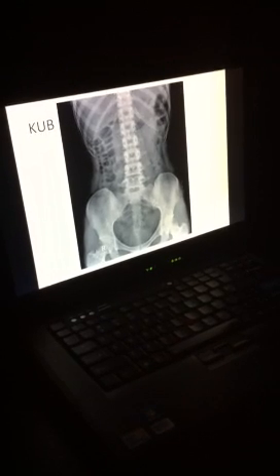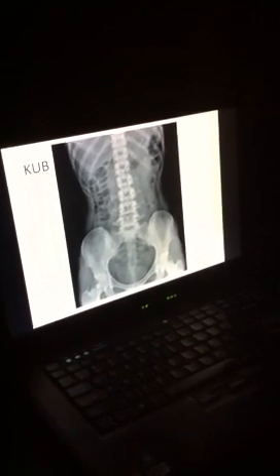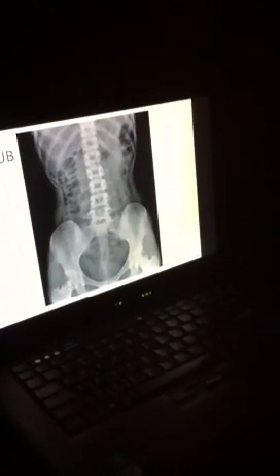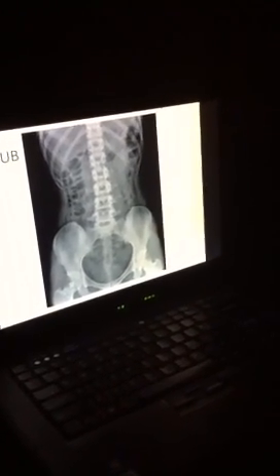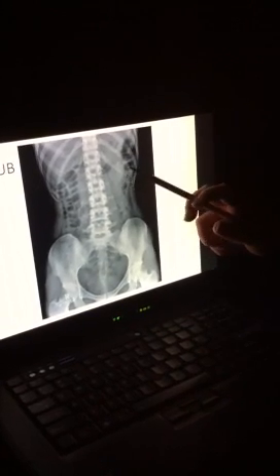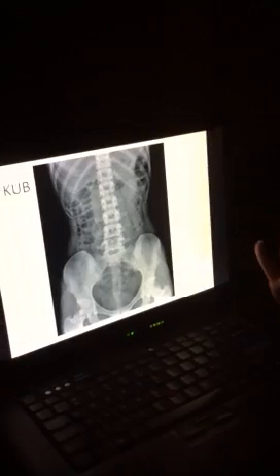Anyone know? No. Okay, that's the splenic flexure of the colon. It's pretty important, so make sure you know it. You can see a little bit of the descending colon, but not too well, since there's not as much air there. That's pretty much it for organs.